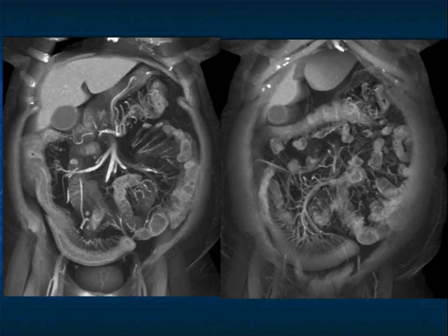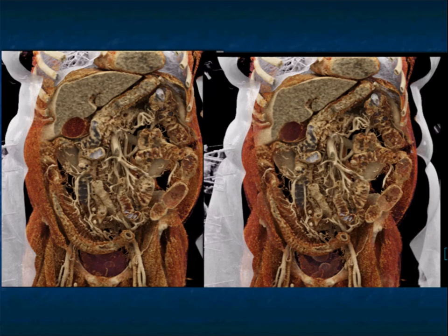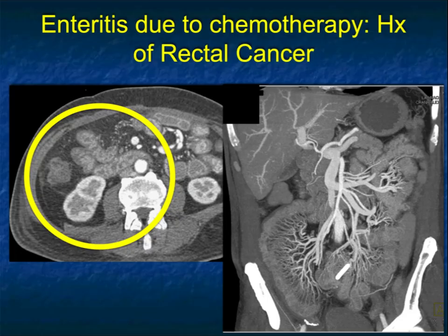And these volume images are particularly good, really showing you both the patient's vasculature as well as the patient's bowel and mesentery. Just a really nice example. And this case really shows very well how extensive the involvement can be. And again, we see this very nicely on the cinematic rendering.